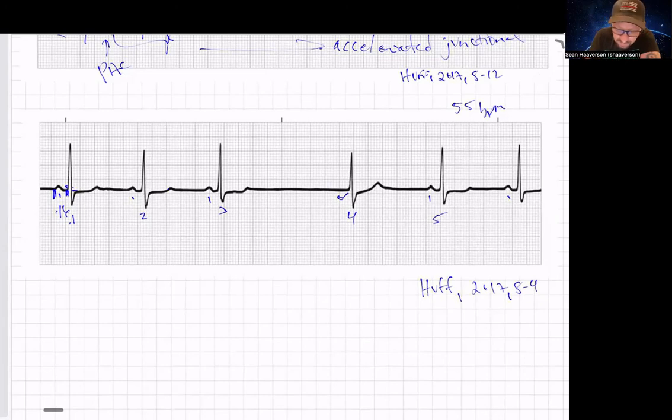So my beats are about that wide, right? So the next one would probably land about here. So this looks like this is delayed, right? And then we go into a beat that has no P wave. QRS is still pretty narrow, but looks slightly different. And then the T wave is a little more pronounced. So morphologically, this is a different beat after the pause.